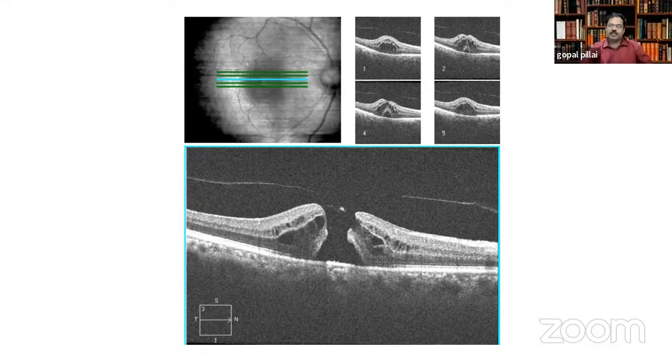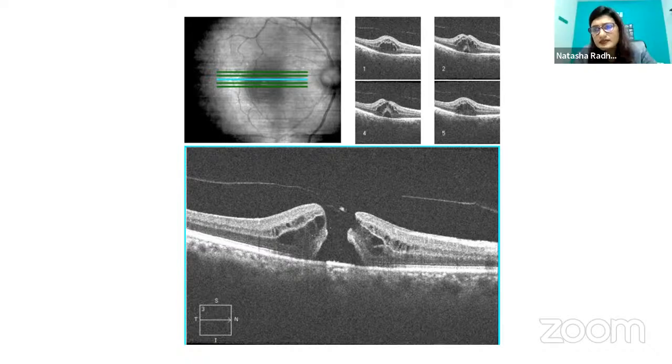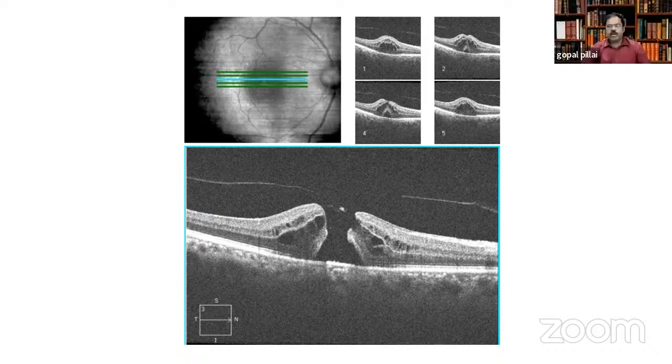Which means a flat, large macular hole is a bad prognosis for progression. If there is more traction like this, you can actually remove the tangential traction and the hole will close like this. Okay. And clinically, one thing that we look at is the duration of the vision loss. So the longer the duration, the lesser likely that the vision will recover well after surgery. Yeah, the newer additions to macular hole surgery.